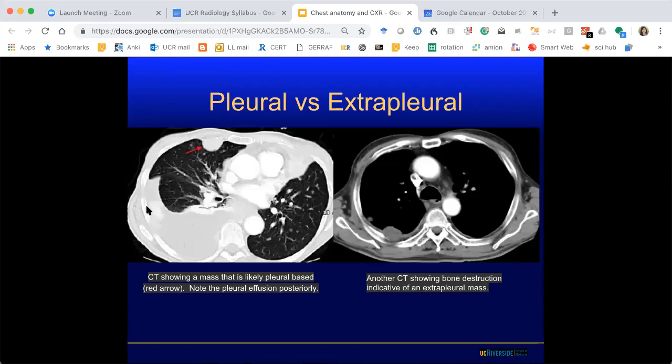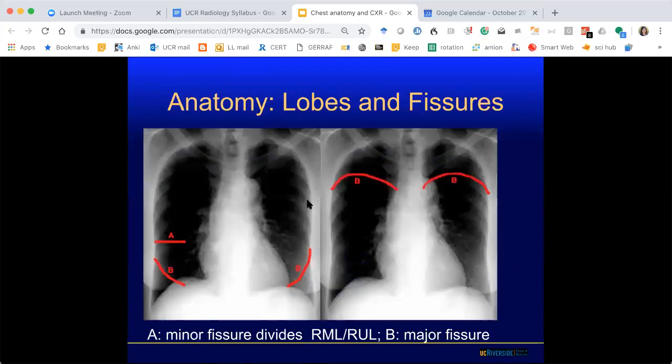Not sure. So if you look, there's this nodule here, pleural metastases. There's another pleural mets here. The window is optimized for the lung parenchyma, so we can't really see it, but you can see the subtle soft tissue in the background. And then there's also mets. There's a little nodule here, a little nodule here, a small nodule here. So this is metastatic disease with malignant effusion.